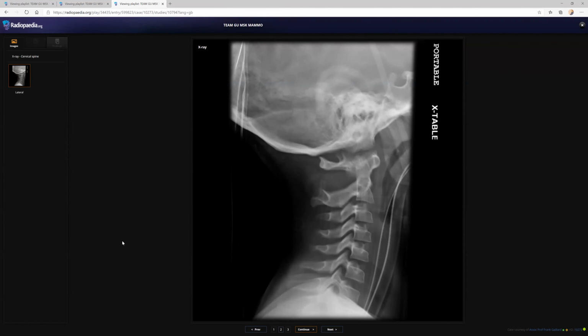Here I can see the anterior spinal line, posterior spinal line, articular pillar line, which are normal, but there is some widening of the spinous process between C1 and C2, fanning of the spinous process. Okay. And what I can see is that there is mild widening of the predental space as well. Okay. I think there is some irregularity anterior to the dens. I would like to see the open mouth view if that is available, or another view. That was non-contributory. Open mouth view was non-contributory. Okay.